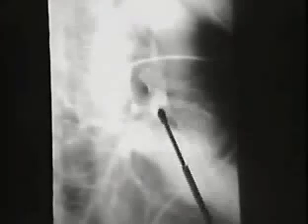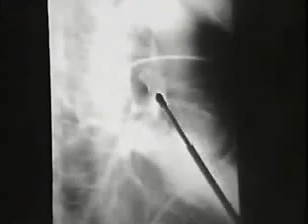The left atrium is down here. The plane of the airway is shown here. Here we see the left bronchus end on. In front of the plane of the airway, we see this vascular structure coming down into the left atrium. That's the left upper pulmonary vein. Notice that the pulmonary veins from the lower lobe come in at quite a different angle into the left atrium. They're coming in from posteriorly and inferiorly. So this is the shadow that we see on a CT scan as we cut our way down toward the left atrium.